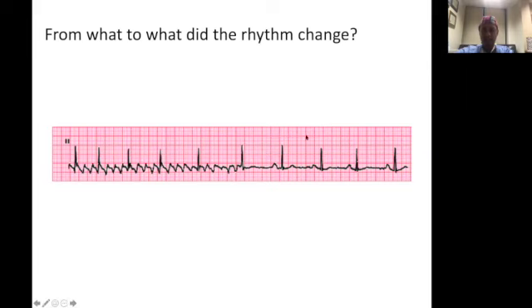How about the second half of the image? The T wave is maybe flat or it is not well visible. There's a T wave right there. You guys can see my mouse, right? Yes. Okay. So to me, the second half of the EKG is normal.